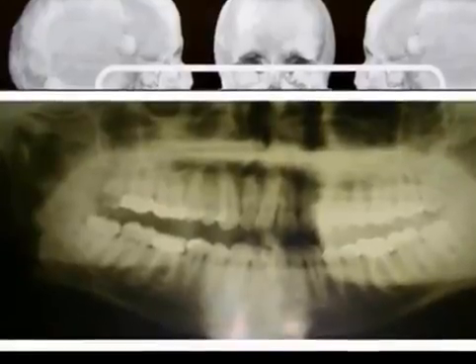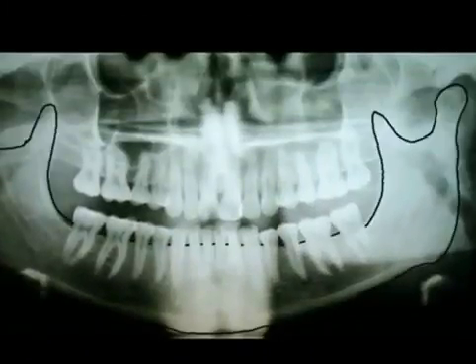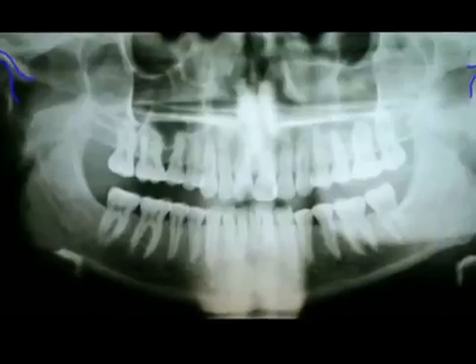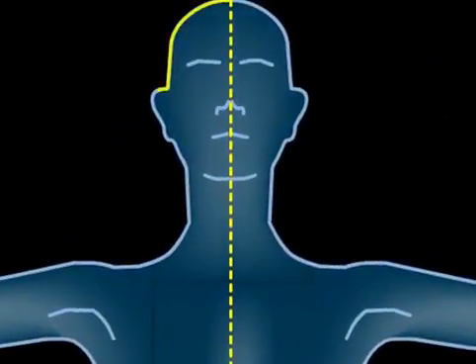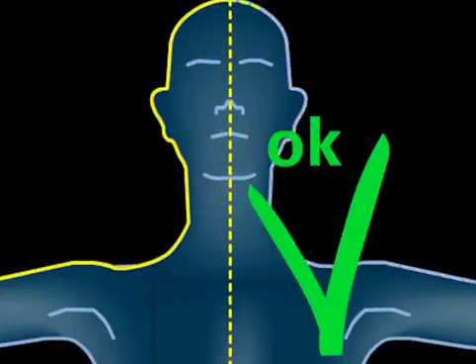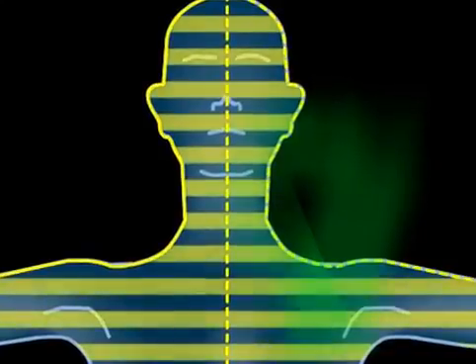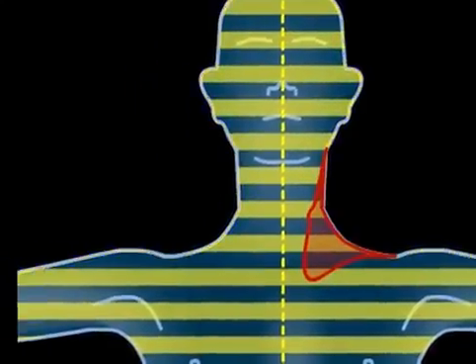Your face looks rolled out on the picture. You can easily recognize the lower jaw, the jaw joints, which are round and regularly spaced when healthy, and there is also a clear joint cleft. Medical experts generally consider symmetrically occurring changes on both sides as benevolent. So if the change in the cleft or the form are symmetric, then this can be considered a variation within the norm, not a pathological change.